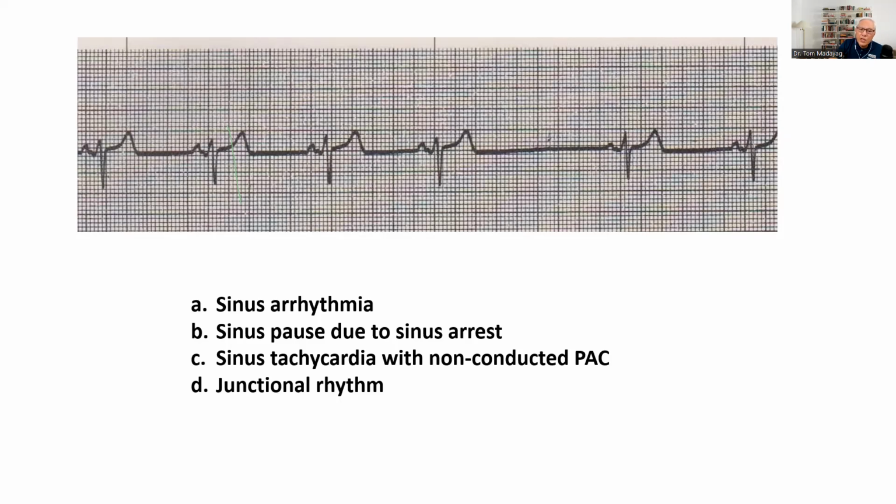Well, as you could see over here, and I'm going to bring back my caliper, there is a regular pattern or rhythm that is established by the P wave in here. As you could see, it's regular, and all of a sudden, there's no more P wave right there.